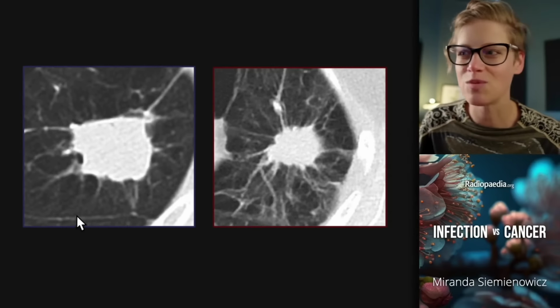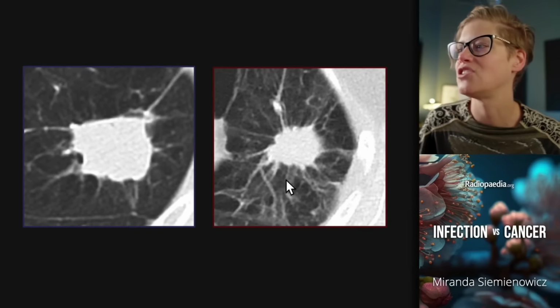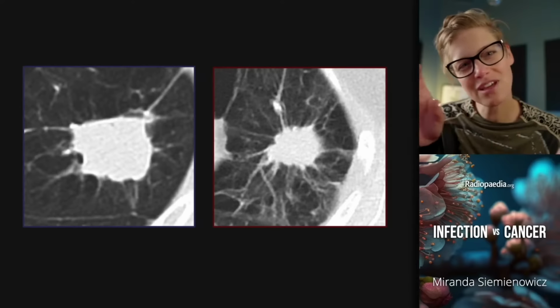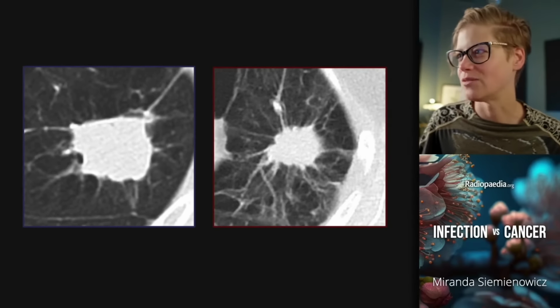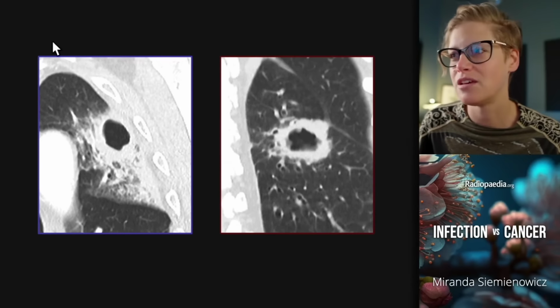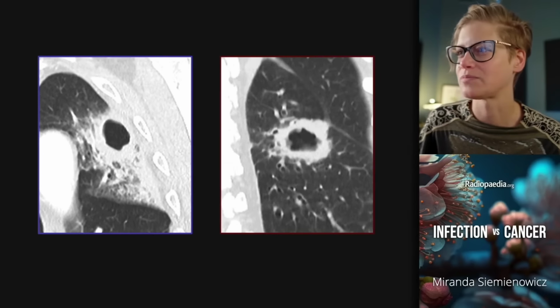We've looked at radiations, we've looked at sparse, long, angulated, benign radiations and fine, thin, dense radiations of the malignant corona radiata, and that's also as opposed to those thick inflammatory bands that we saw earlier, which are again a benign feature. We've looked at surrounding lung, we've looked at lesions that are confluent and contiguous with extensive ground glass and consolidation as being the appearance of infection as opposed to clean surrounding lung.